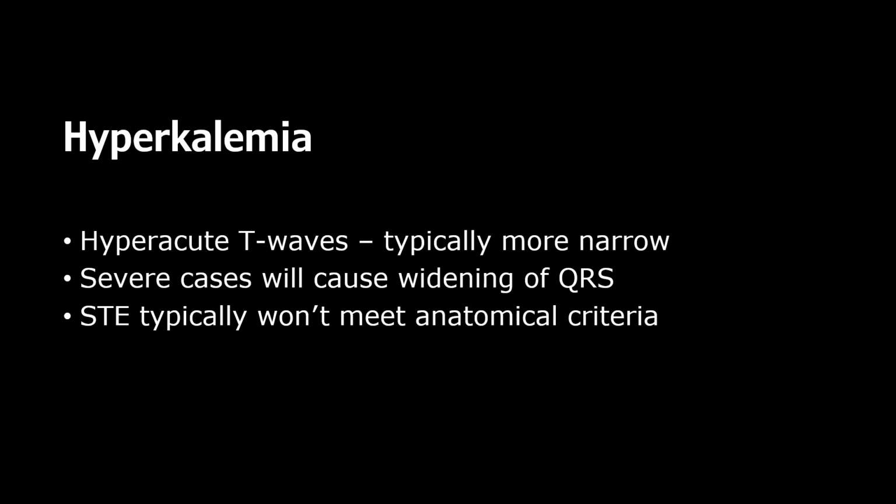Hyperkalemia is a difficult one. I sometimes lump it into both categories because it can produce some findings that are pretty hard to differentiate between the two. And I always say, especially if you work in hospital or have access to point of care lab testing, this is very easy: the easiest way to differentiate is to literally just measure their potassium. If their potassium is 9, you probably need to fix that before we jump straight to the STEMI activation. Not that you can't have both. Nothing is impossible, but it would definitely give me pause. Classically, there are some differences.